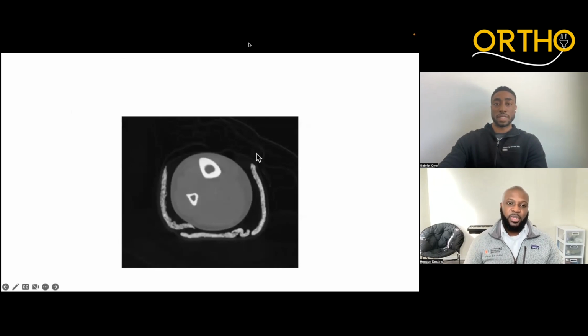Now, are most of these x-rays going to come with the directional label, whether it's an R or L? They should typically label them, but obviously sometimes they're not labeled. You can generally say, hey, the fibula is lateral, so this is probably right versus left. But who knows if the image is flipped? There's really no way to definitively tell.